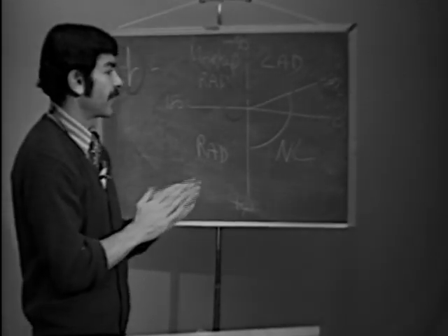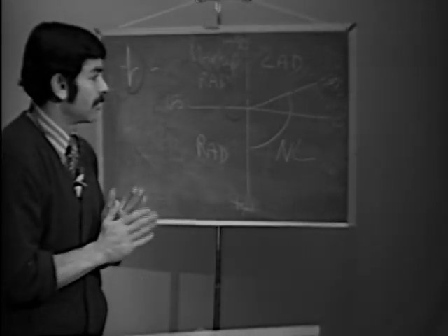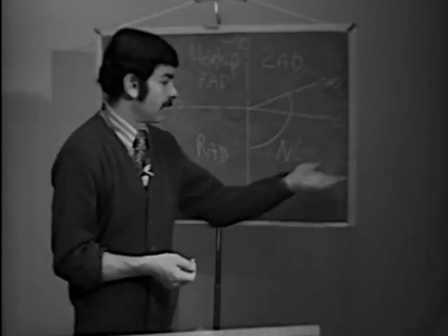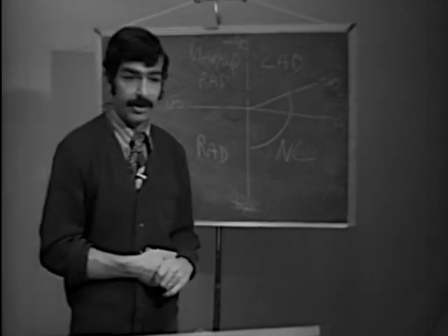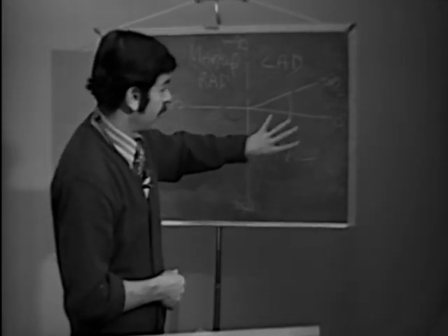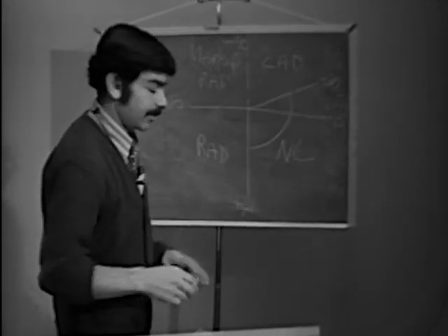Okay, so these are the axes. And so instead of defining an axis in terms of degrees, which is certainly valid, you can say normal axis, left axis, etc.